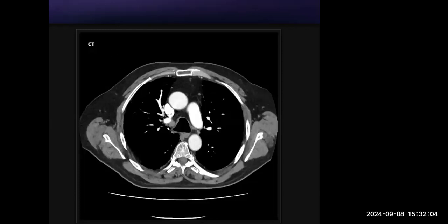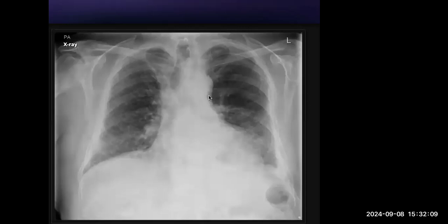Okay. So I think this was the first case I showed you. This was a case of thoracic splenosis. You were right. But please look at your review areas. You cannot afford to miss the opacities seen in the retrocardiac region, because this can also be a malignancy with lymphangitis carcinomatosis. Now you're seeing a mass in the retrocardiac region, but that word did not come from you, that this could be a lung mass with lymphangitic picture in the background of reticular opacities.